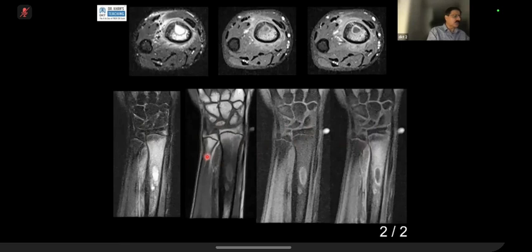Now, key thing is that the marrow edema will be low in signal on T1 and high on the stir sequence. It should be lower than the adjacent muscles. And if you are talking about spine, then it should be lower than the intervertebral disc. So in this case, there is an abscess here and with a lot of edema.